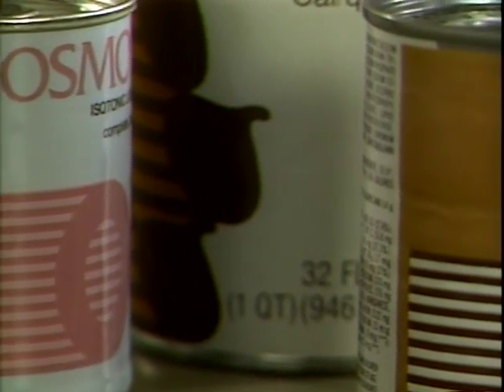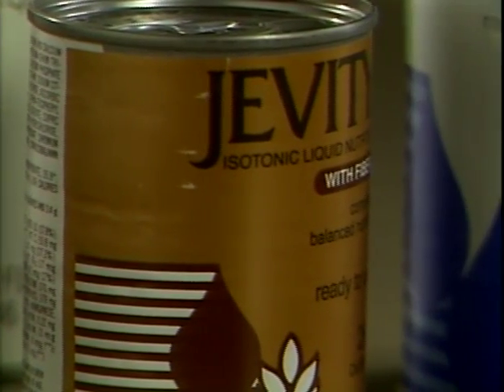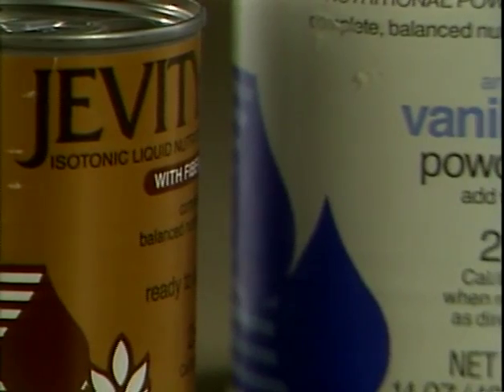The physician will prescribe the composition of nutrients in the formula for enteral feedings, the fluid requirements, and the administration schedule. The patient or family caregiver will prepare the formula according to the prescription. It is possible to make a formula from scratch in the home using a blender. However, most enteral feedings use commercially prepared products, sterile canned or bottled liquids, powdered or concentrated products. Some liquids can be administered simply by opening a can.